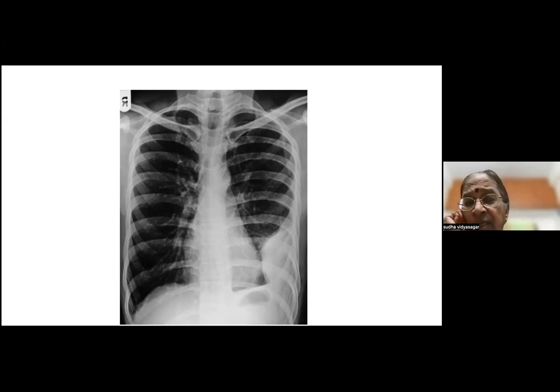Okay, one thing I agree, it's a pleural-based lesion. It could be a loculated pleural effusion, correct? Because the density looks like that of the heart. It is fluid. It is silhouetting the diaphragm. It is based on the pleural surface, on the lateral surface, and it's just got no particular shape or size. And so that may be a loculated pleural effusion, unlikely to shift the trachea or the mediastinum. So it's just sitting there. Okay, so that would be your best bet for this X-ray.